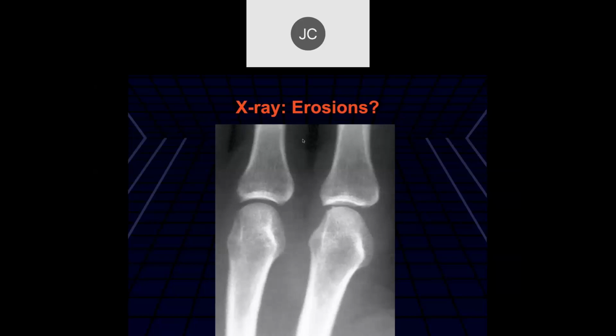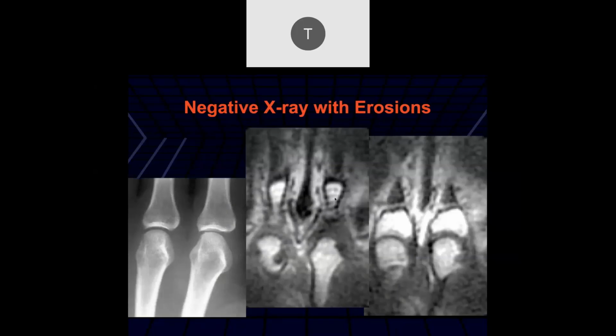Okay, Tayson, here are some cone down X-rays on a patient with rheumatoid arthritis and pain. Maybe erosions at the metacarpal heads. I mean, without any context, I probably wouldn't have said anything about it. Okay, so then for a while we used a very low field tabletop device that used a non-uniform magnetic field.